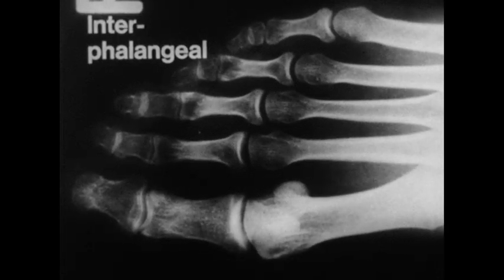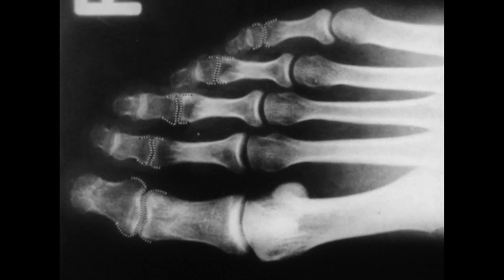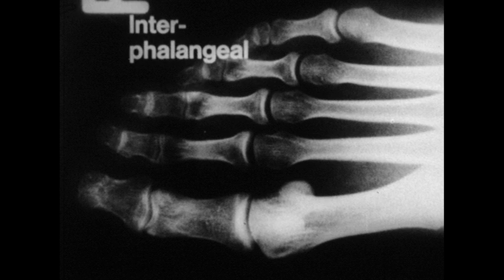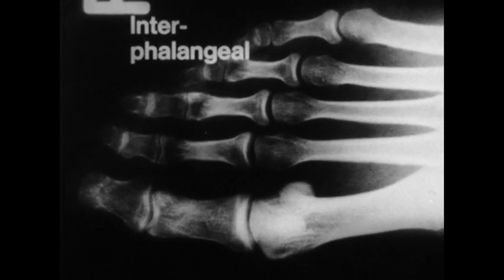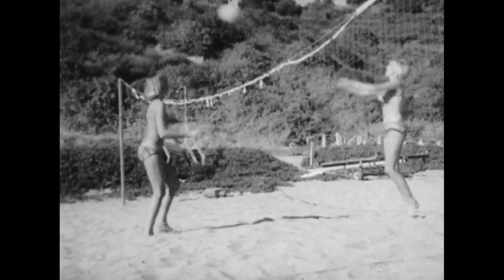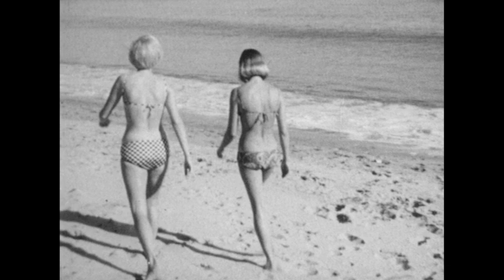Interphalangeal articulations are hinges. Each has an articular capsule, synovial membrane, and plantar and collateral ligaments functioning similarly to those of the interphalangeal joints of the hand. Motions are confined to flexion and extension. Only through careful and intensive study can the student appreciate the complexities and interesting variety of movements of the human body.